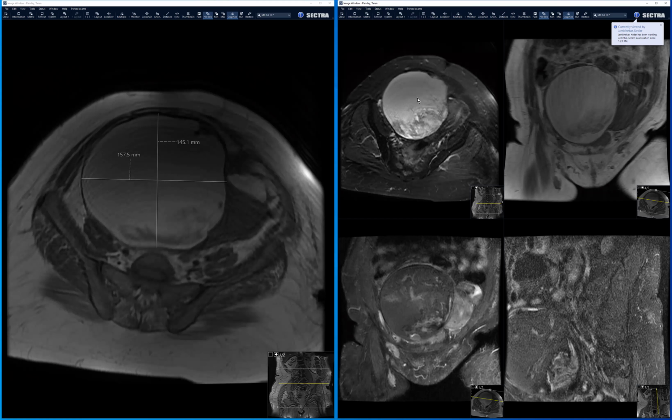Wow. And you only do STIR on here, we only do it on our MSK protocols. This is an outside study, so I have no idea why they did it, but I thought it was a great case for physics purposes. It is. Awesome. Excellent.